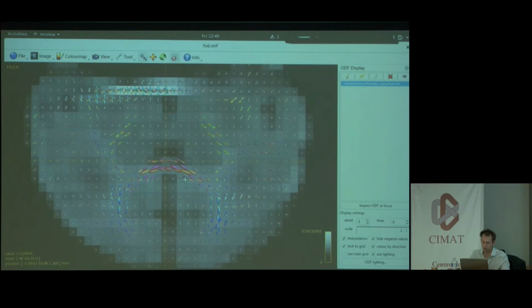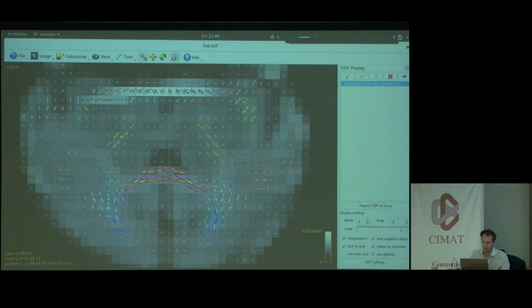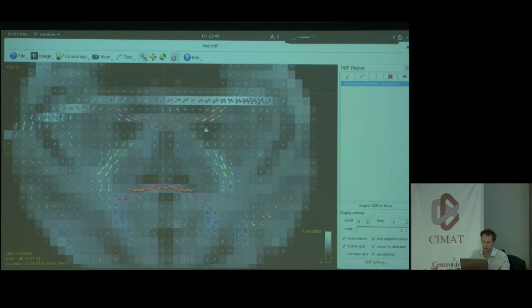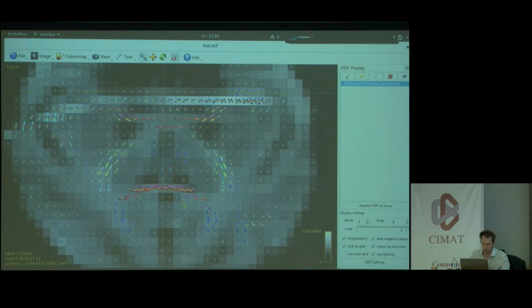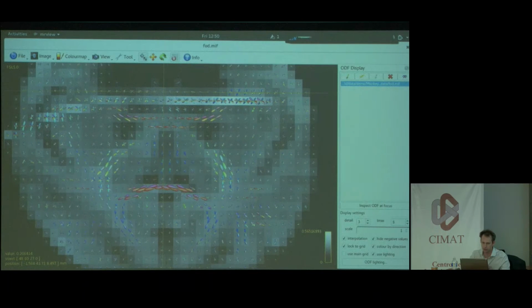So this is magically fixed itself. You see the fat here is really screwing up that part of the image. It's a shame it's going there, but it's just above the anterior commissure. Now, the image is upside down, which is annoying. I wish I could fix that. What can I do to fix that without messing everything else up? Not a great deal.